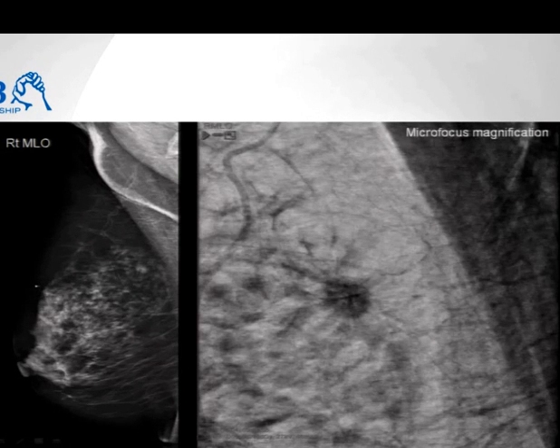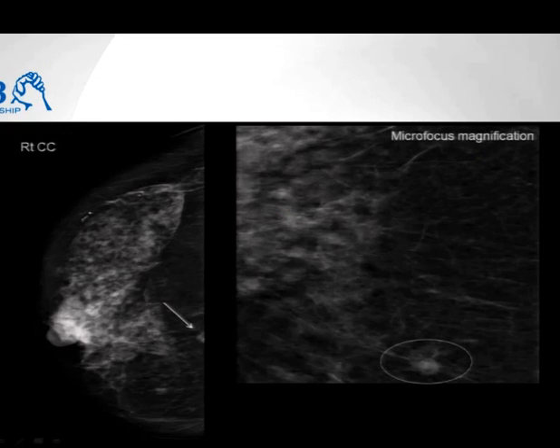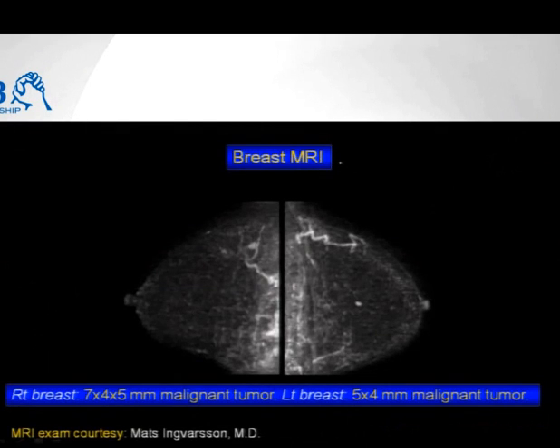I have to localize it for the surgeon. But you know, the positioning is not okay. Where is it? I don't know. So you reposition her when this one really is on the film, and then there is a little adipose tissue. And this is in the medial half. But then you do the due diligence here, and you send the patient to MR, as every breast cancer patient should have MR. And then you have this cancer, what you found.